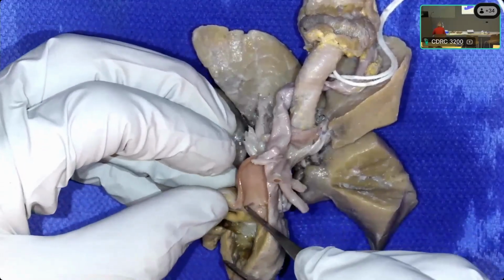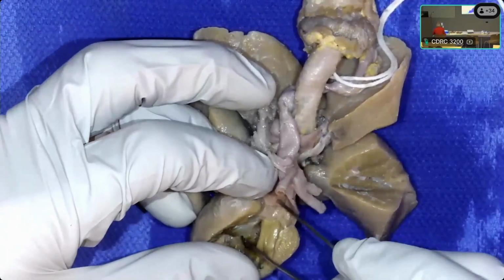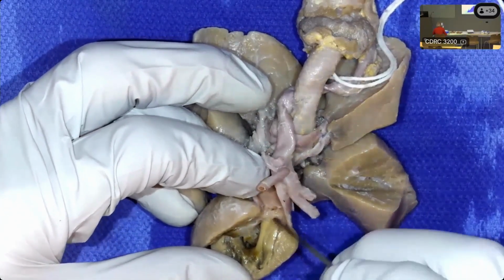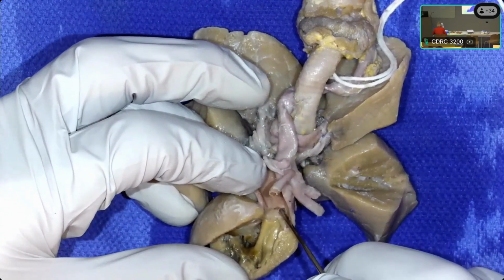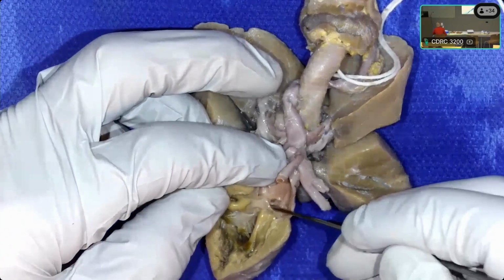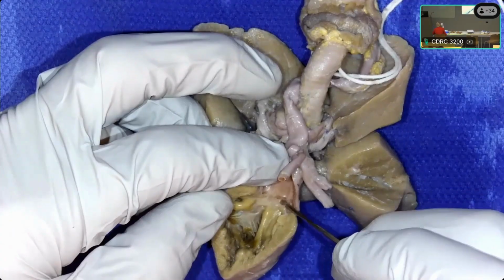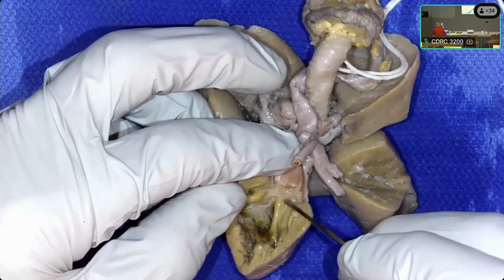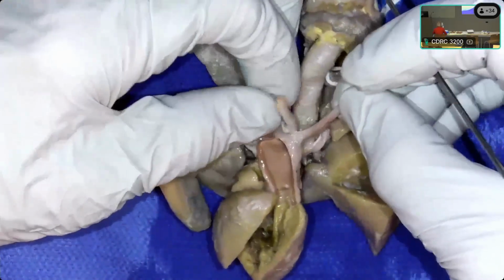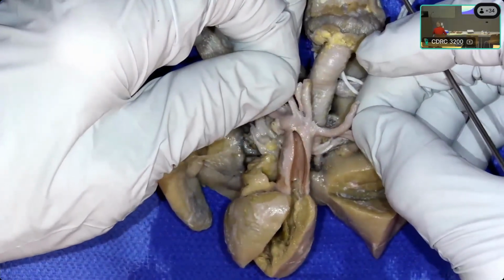There are coronary orifices here. There's one there. Actually, they may be side by side, both from the same sinus. A slit-like, there's one there, but there is a very small slit-like one right here that's hard to see. And when we look at the branching pattern from the aortic arch, it's a right arch with mirror-imaged branching.